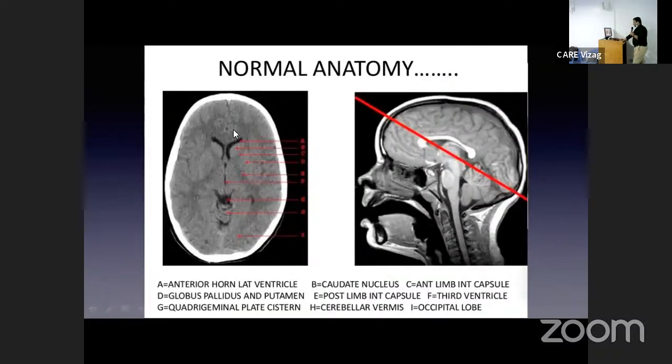So, another section higher, you start the beginning of the basal ganglia here. You're able to see the caudate nucleus lining the frontal horn, and you see the lentiform nucleus. Between the caudate and the lentiform, you see a gray colored structure. So these are gray matter, and you see white matter. This white matter is again divided into the anterior limb of the internal capsule, genu, and the posterior limb of the internal capsule.